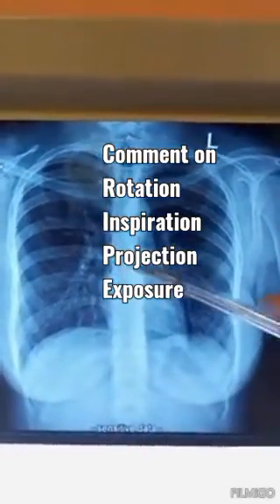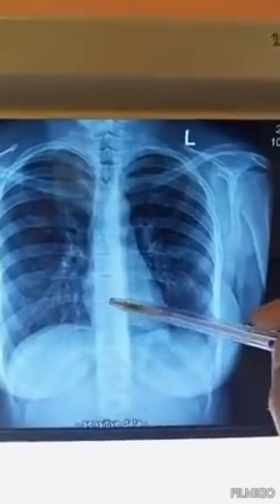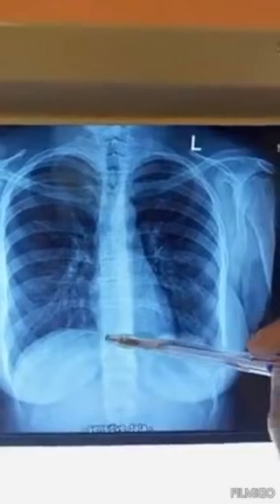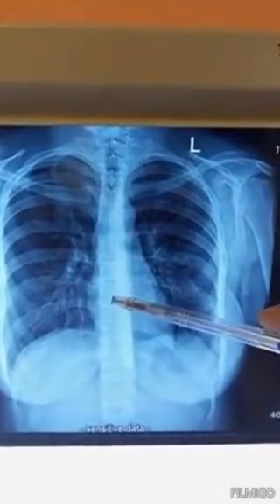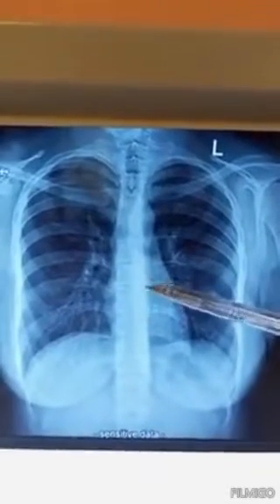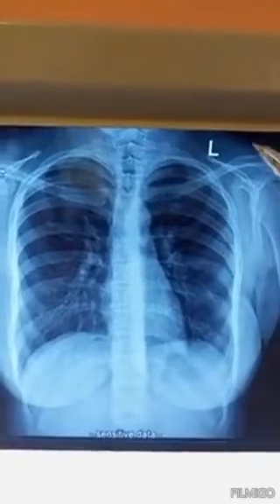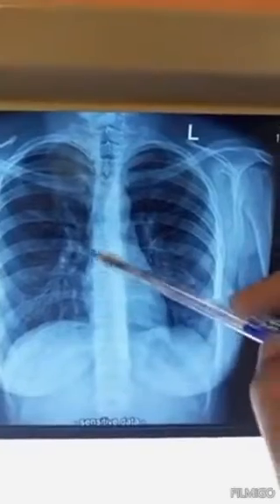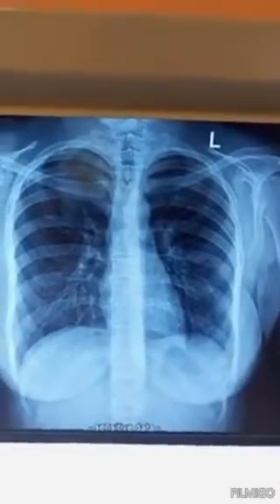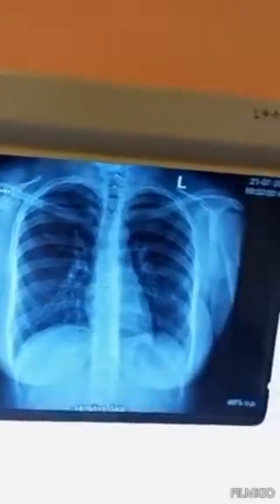If they are very much clear, and you can see a very definite structure of the vertebra with the intervertebral disc, it means that the vertebra has been exposed to a moderate amount, or high doses of X-ray have been used. So comment on the spinous process and the vertebral body if you want to see how much the exposure was, right?